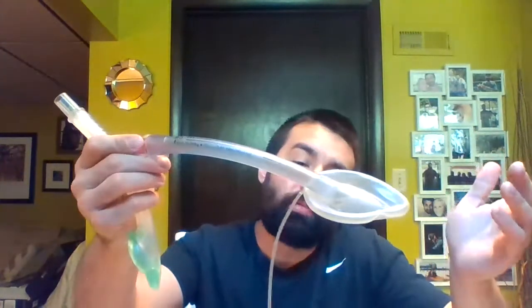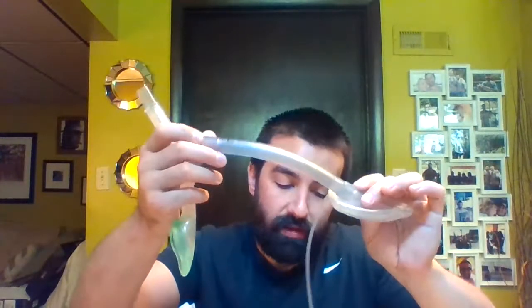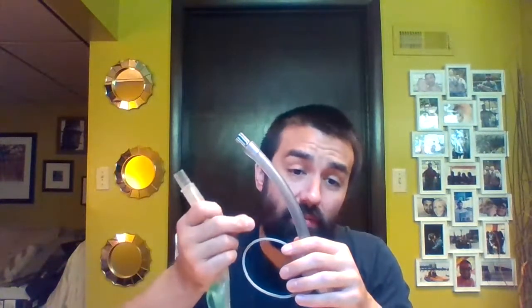All right. Really, placing these things is beyond the scope of this video here today, but you need a big syringe. They do make intubating LMAs where you can get that in, and then there's a piece you can use to try and direct an ET tube through there and do a kind of blind intubation, but that doesn't always work, and not every place is going to have those.